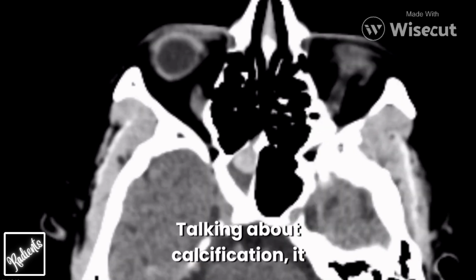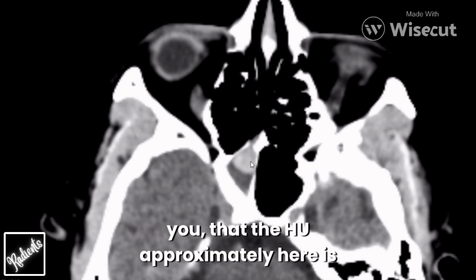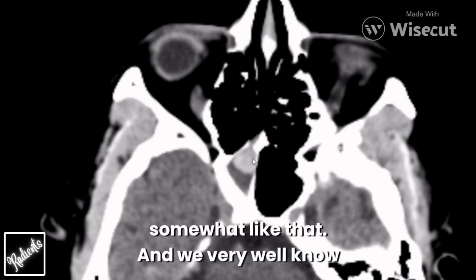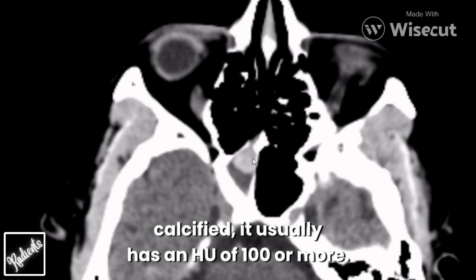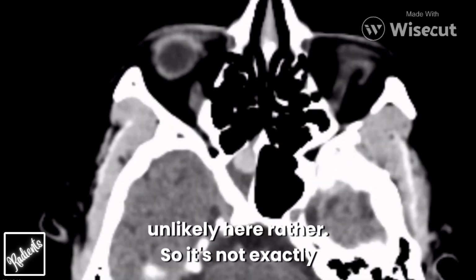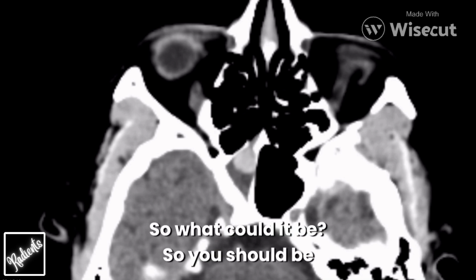Talking about calcification, it could be calcification, but for that we need to see the HU. So let me tell you that the HU approximately here is between 50 to 70. So the average HU is basically 60, 70, somewhat like that. And we very well know that usually if you find something that is calcified, it usually has an HU of 100 or more. So calcification also seems a bit rare, or rather unlikely here. So it's not exactly calcification, it's not hemorrhage, and it does not exactly look like chronic inspissated secretion. So what could it be?